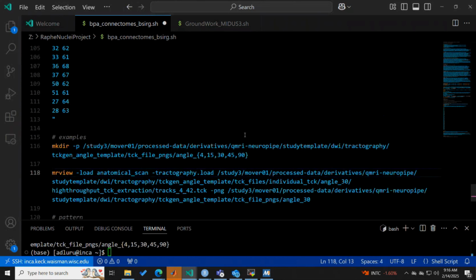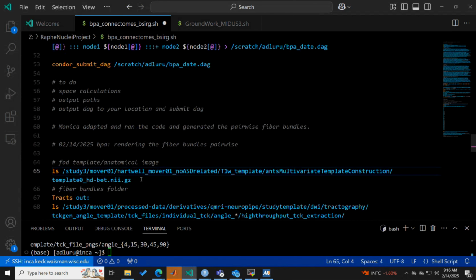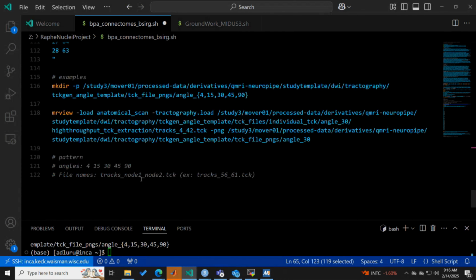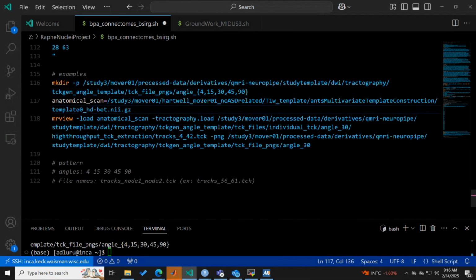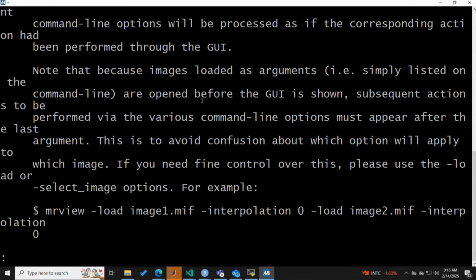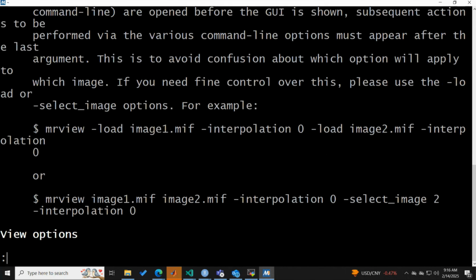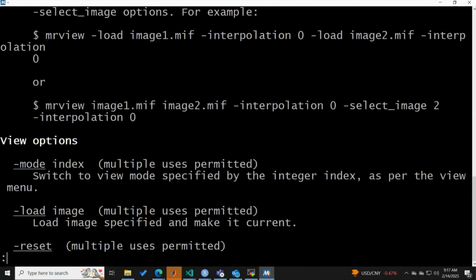So let's start fixing this. This would be load. You already gave me this, sorry. So let's make a variable. Okay, let's create variable names. Okay, so that's step one. We just loaded the underlay. Then, you could even do without load, but let's have load. It kind of helps. So mode.